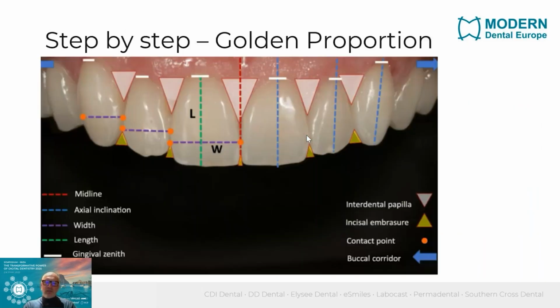Okay, so what is important for the actual smile design is that we take into account, and that's what we do in the software, in the ExoCAD Smile Creator software. We look at the teeth, at the rest dentition, at the face, and then it starts by analyzing all those aesthetic data and guidelines. We have to know, first of all, if it's a man or a woman, so the gender, the midline. Sometimes we have a midline shift.